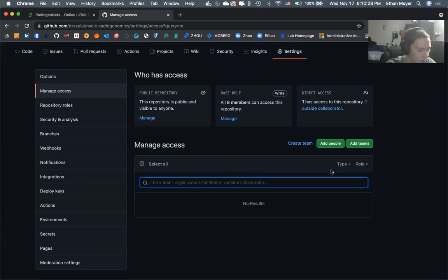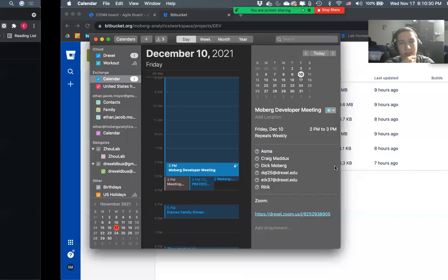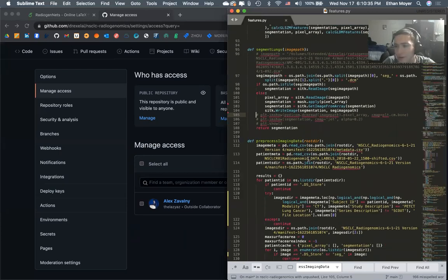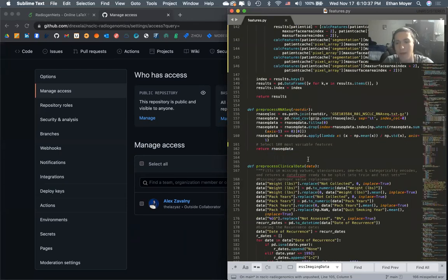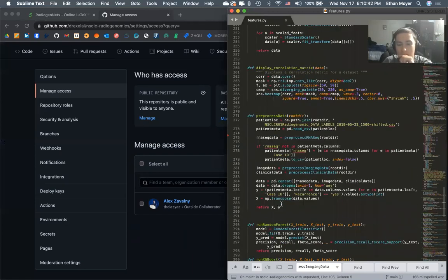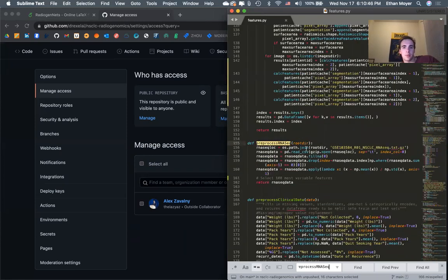And for the imaging data, there's a lot of different functions, but they're mainly based on the edges and lines. Would that be correct? Well, there are shape-based features, 2D and 3D, and first order. I don't think I did this right. I've got to do that.